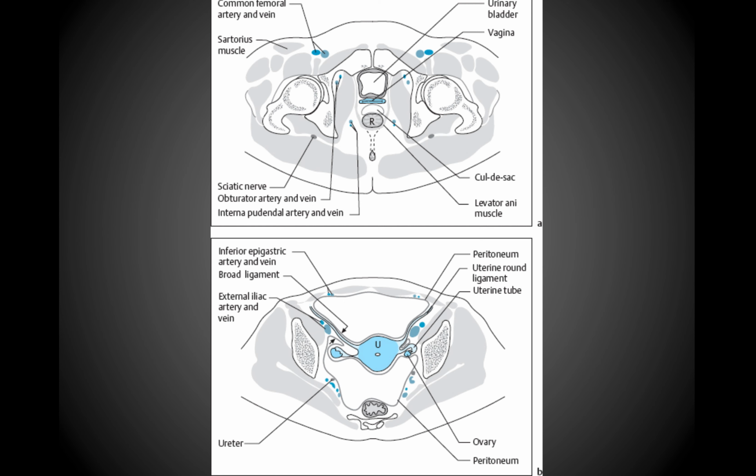compartment of the thigh. So again, we'll just point that out here briefly, but realize that we'll be getting a lot more into the musculoskeletal anatomy of the lower extremity once we move into the extremity lectures. So that'll be in the musculoskeletal lectures.